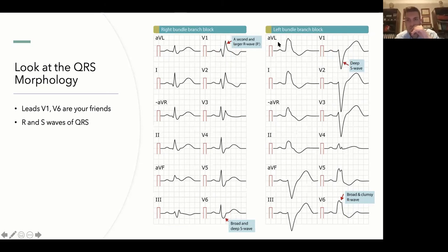Yes, everyone follows. Good. The thing is that, as we said, if this was a ventricular extrasystole, can someone tell me, would it be from the right ventricle or from the left ventricle? Where would the extrasystole originate? From the left, even though it has a right bundle branch morphology. Excellent. And the opposite, of course, would be for the left bundle branch block, because with this morphology in V5 and V6, we will talk about problems from the right ventricle.